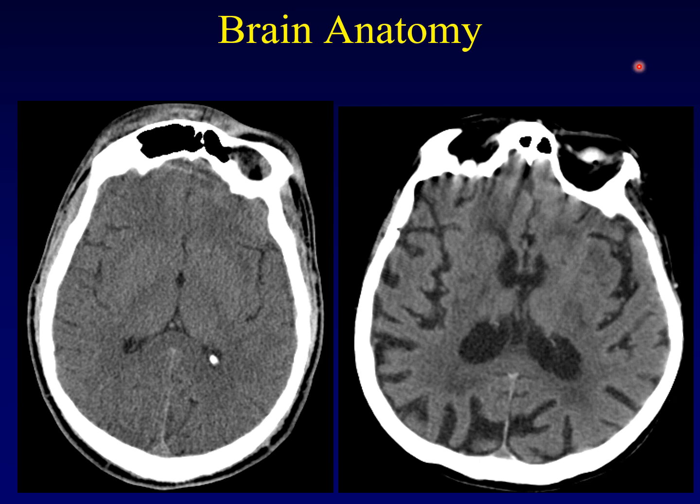There is a normal process of atrophy that is inevitable, that we all undergo as we get older. Even as you are sitting here listening to this lecture, your brain is slowly atrophying from this into this. In order to understand what's normal for any individual patient, you have to have a sense of what the range of normal atrophy is for someone of that age. It's not going to be the same for every single person, but there's a range of expected findings.